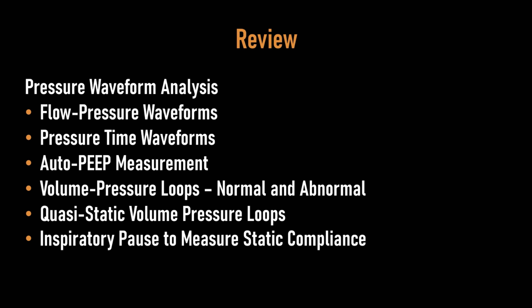It doesn't matter what way you describe it. It is only ever described one way on the ventilator. That's volume on the y-axis, pressure on the x-axis. And I showed you normal volume pressure loops and abnormal loops. We then discussed quasi-static volume pressure loops that you will read about in the journals, but you are unlikely to ever perform in clinical practice. Finally, I discussed the inspiratory pause maneuver to actually measure static compliance and true plateau pressure from the pressure waveform.